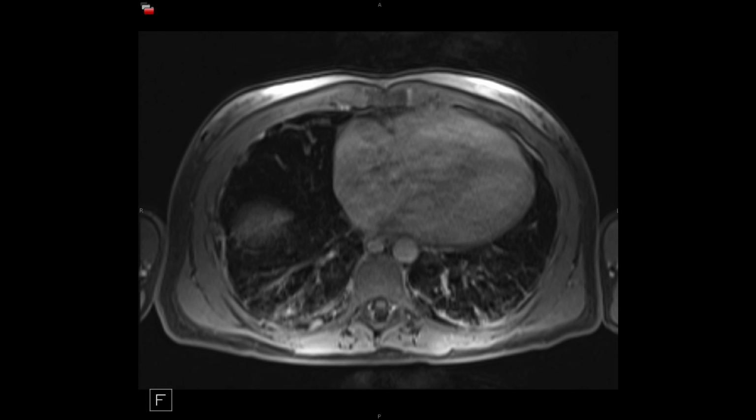And in those patients, it's important to report the proximal extent of disease for surgical planning. In other words, how proximal do you see thrombus? And using the coronal images is very helpful for looking at involvement of the right and left pulmonary arteries.